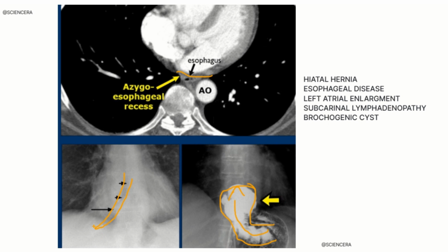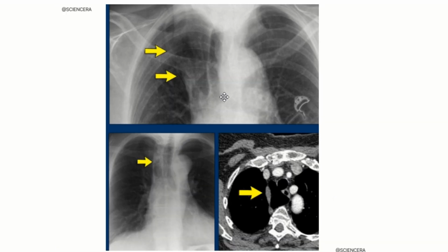Now what will happen? We notice that the azygoesophageal line is not where it's supposed to be, and then we put in something called barium contrast compound. We put it in the stomach, and then we take an X-ray, which will clearly indicate that there is something wrong. And we can see in the X-ray the area where they think the hiatal hernia is. So in this case, you can see this part. This part indicates that there is a hiatal hernia here. Let's look at the top image here.